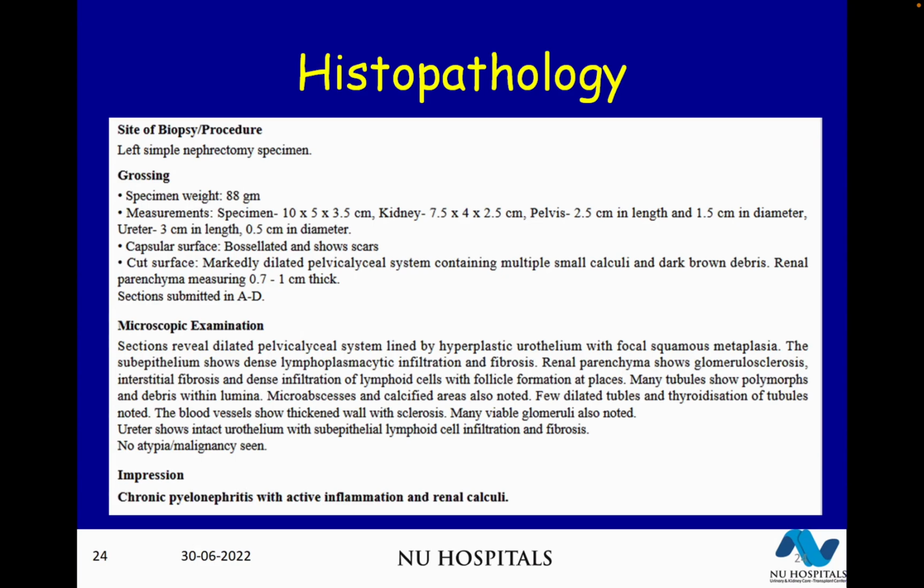I told you, look at the size of the renal artery. In a small kidney, the artery is small. You don't need huge blood flow in a patient who has got a small kidney. What are the classical features of chronic pyelonephritis versus hypoplastic kidney? In both of them the kidney is small, the artery is small, but in chronic pyelonephritis the kidney is scarred and small, whereas in hypoplastic kidney the kidney is not scarred but still small, but the artery size remains the same. You got it?